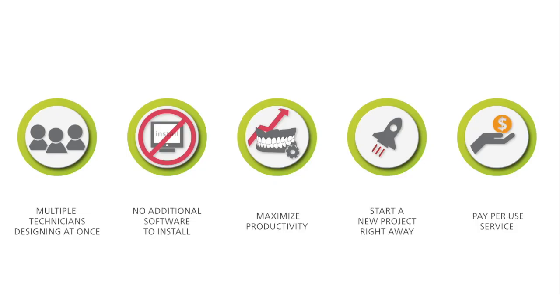Please note that by utilizing the Dentca Design web service, you can have multiple technicians designing cases at once without any software installation, thus maximizing productivity at your laboratory. Also, while the cases are undergoing final rendering in our server, you can start a new project without having to wait for final generation. The Dentca Design software offers you a pay-by-use service which will allow you to design cases for maximized output in 3D printed format in a simple and efficient way.